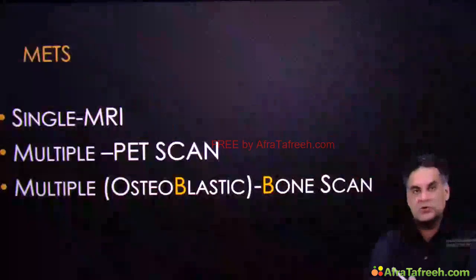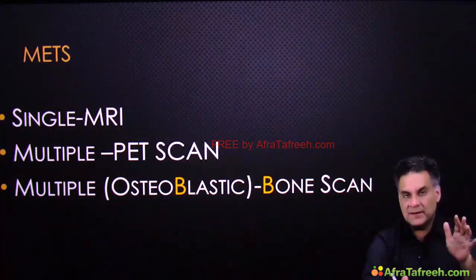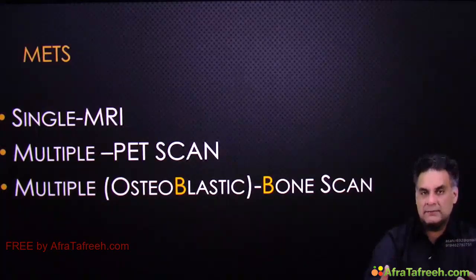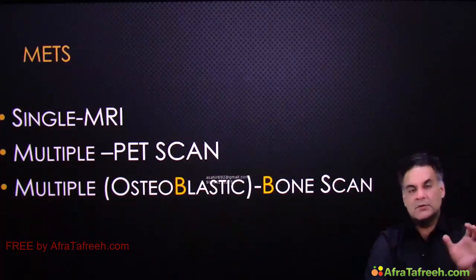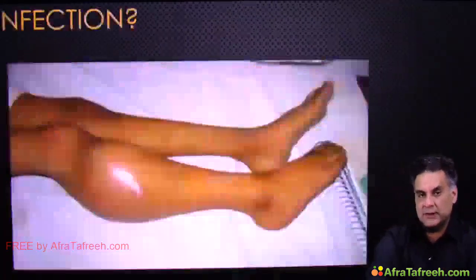So if they show you a single metastasis, MRI, because in orthopedics, nothing compares to MRI. But multiple, PET scan. Multiple osteoblastic, they have to mention bone scan, because bone scan can pick up osteoblastic mets where PET scan is quiet.